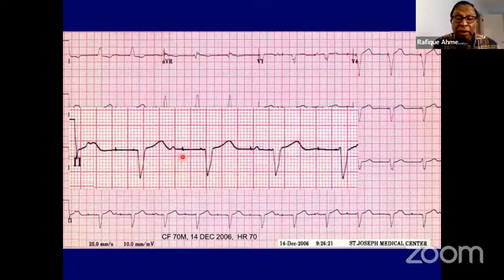Now, with this P wave, there is this atrial pacing spike, there is no P wave. By this, I cannot tell that there is failure to capture because there is a P wave, and if it paces immediately after the P wave, it can be refractory. So this one tells me there is failure to capture the atrium, and this one tells me there is failure to sense the atrium because it should not have paced here. It should have seen this.